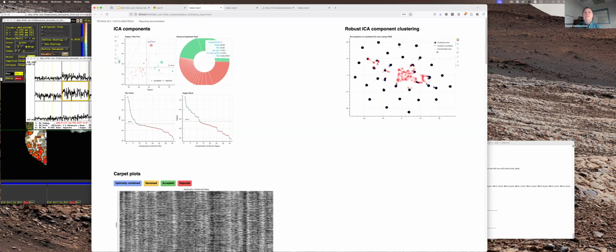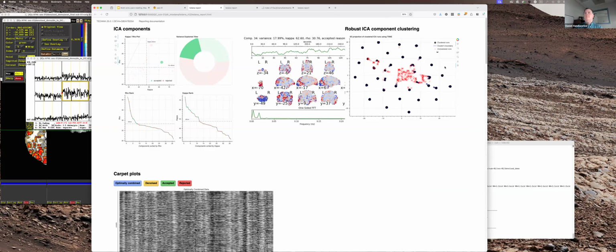So what we can see is that in this run, about half the variance was accepted, half was rejected. Ooh, lovely live demoing.